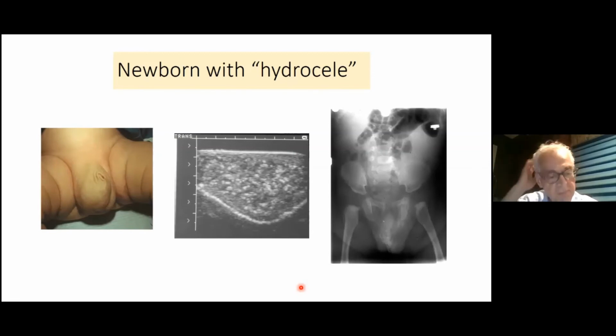So this is actually meconium periorchitis. This child had meconium peritonitis, had a patent processus at the time. The meconium went down into the scrotum. It gave you this ground glass kind of echogenic appearance. You saw calcification here, and you can't see it well on this KUB, but there's calcification in different parts of the belly. So yes, this is an intrauterine gut perforation.